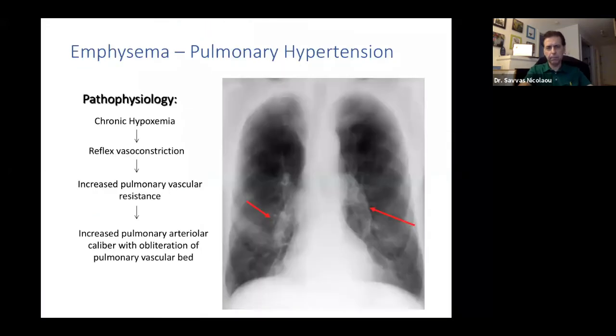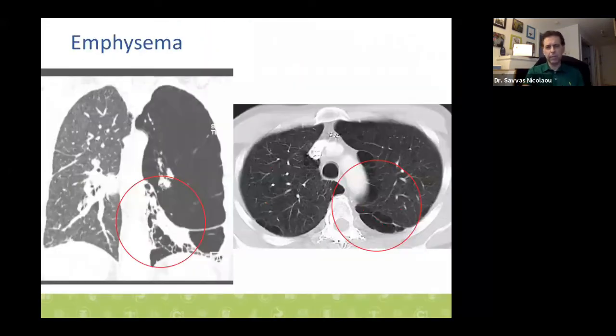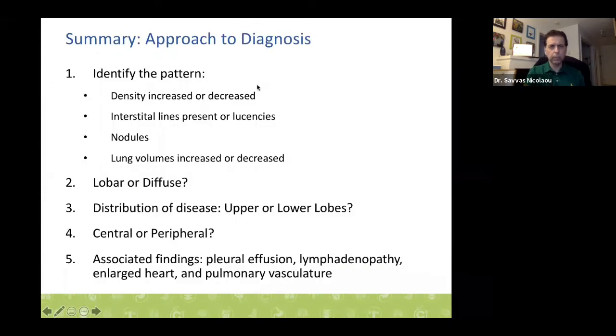In this particular example, we have a coronal image of a COPD patient, marked lucent left lung with bullous emphysematous disease, some other bulla within the left lung and right lung in a subpleural distribution.